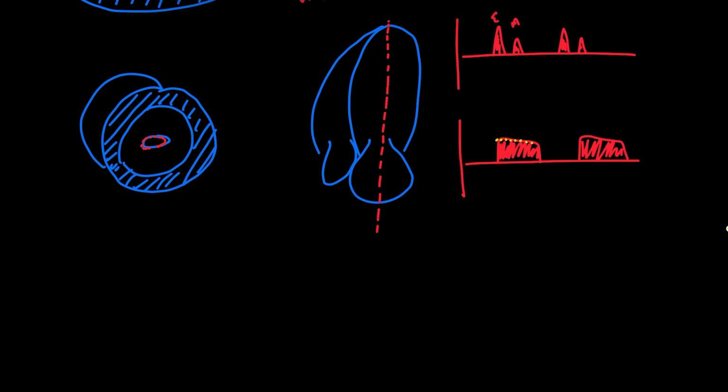There's an ongoing gradient which leads to ongoing flow because the left ventricle does not appropriately quickly fill. It's slowly filling, but there's an ongoing pressure gradient that drives that ongoing flow. And we can actually use this to quantify. So if you were to trace this out all the way to here, this is the deceleration time.